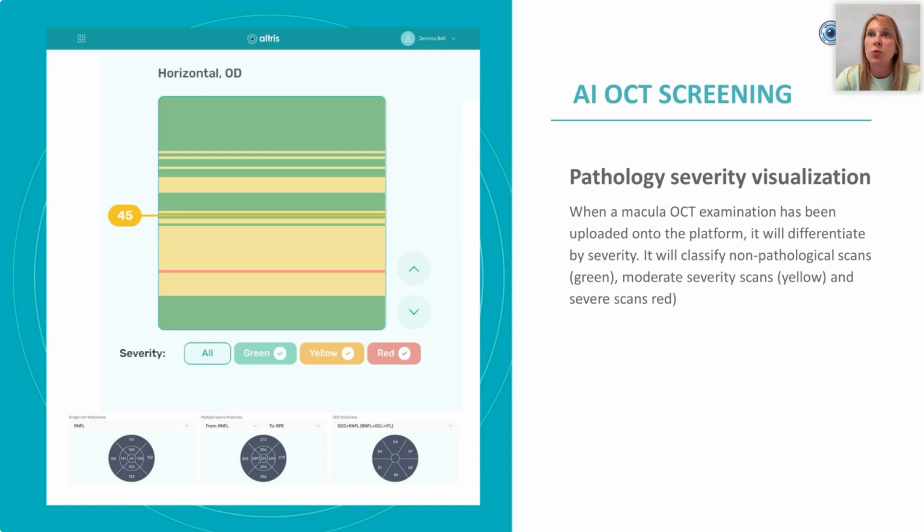So what do we upload? We upload DICOMs. DICOM is a file that each OCT device has, and this file contains information about the device itself, about the protocol of investigation, all the images, and the number of images can be different in different scanning protocols. It can start from, I think, 13 in some devices.